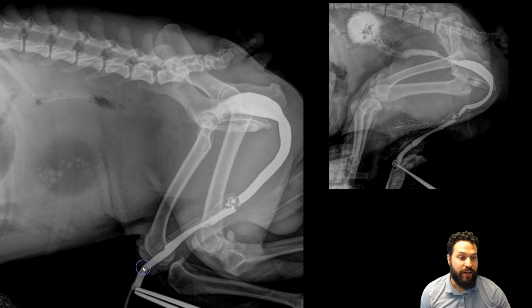So here we have kind of our first shot. We filled the urethra. We can see a number of these radiopaque stones as well as a large gas bubble, and the bladder is still pretty distended. And then an additional shot here, still some in the urethra. Now we're starting to get some of that contrast medium accumulate in the bladder and is outlining some of these calculi as filling defects at this point. So that's kind of what we might expect once we've added contrast medium into the picture for us to be able to actually see these as filling defects.